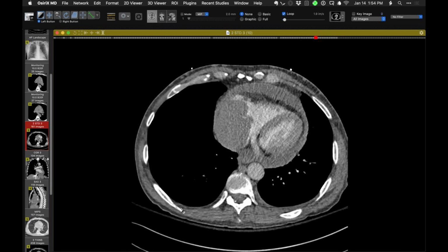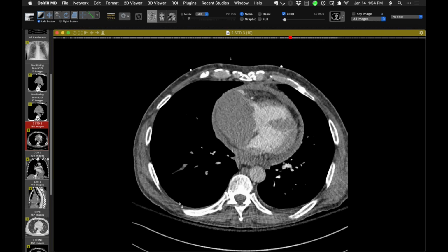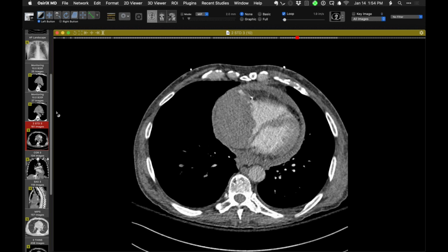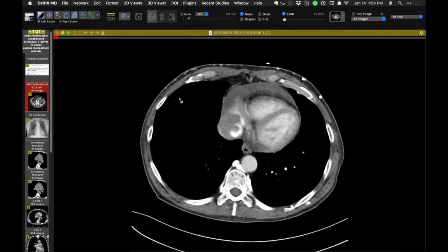Instead, the contrast medium deviated substantially into all kinds of collateral vessels. So they actually injected the patient, I'm sure not by a power injector, via a lower extremity vein.